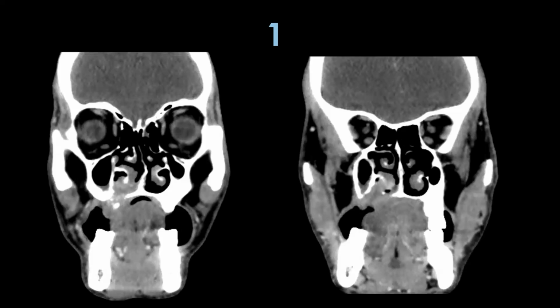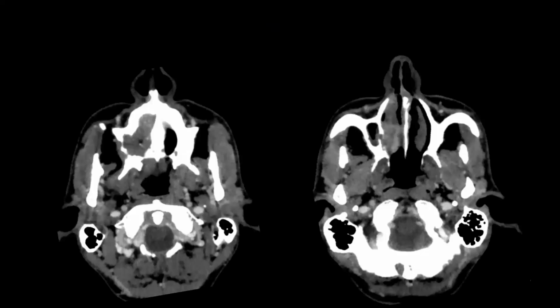Yes. So there is a lesion seen on the right side of the maxilla. It is eroding the palate, involving the right side lateral nasal cavity lower down, and I'll show the next sections here. It is involving the palate. Pterygoid plates are normal. Close to the posterolateral wall of the maxillary sinus. So ITF involvement is there? No ITF involvement. There's some soft tissue into the retromaxillary area. There is little erosion here and there is soft tissue in the fat as well here. So low ITF, small early disease.